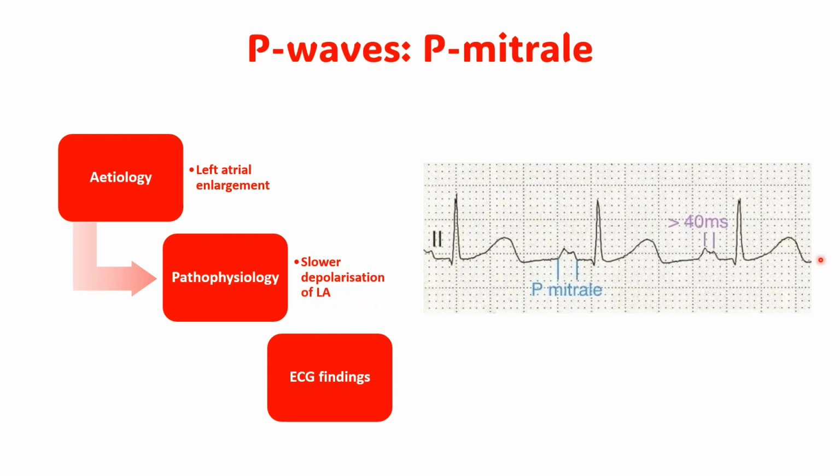Okay, so there's going to be a longer duration of atrial depolarization, and this produces that bifid aspect of the P wave. Bifid essentially just means split, because if we look at the definition, we know that the definition of P-mitrale is you have a bifid P wave in leads 2, where the peak to peak interval, so the peak of each section of the bifid wave, is greater than 0.04 seconds, or 1 small square, and it's also biphasic in V1.